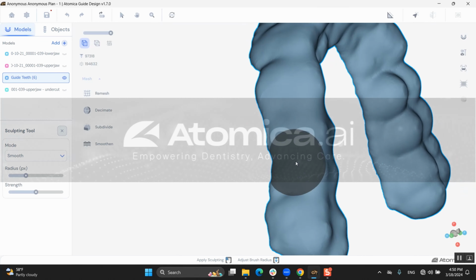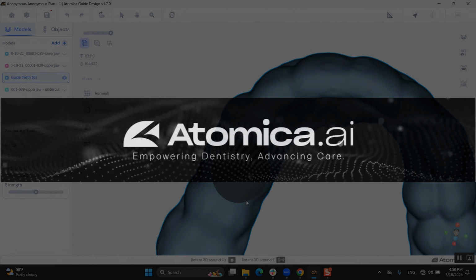This was a quick demo on Atomica New Splint module. Feel free to contact us for more details.